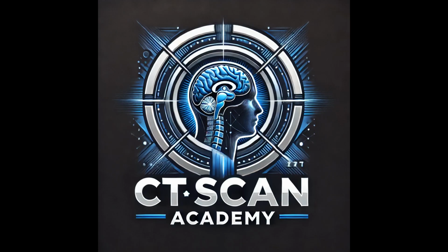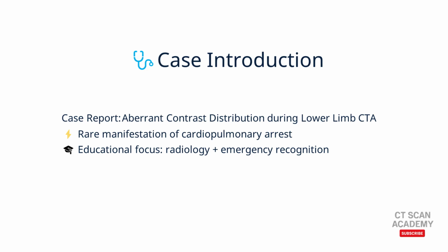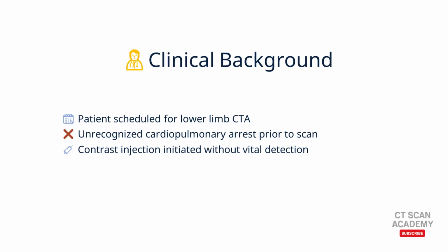Today, we will discuss a rare and highly educational case involving aberrant contrast distribution during a lower limb CTA. This case represents an unusual manifestation of cardiopulmonary arrest that went unrecognized prior to the scan. It provides an excellent opportunity to understand both the radiologic features and the critical importance of early emergency recognition in the imaging environment. The patient was scheduled for a lower limb CTA.